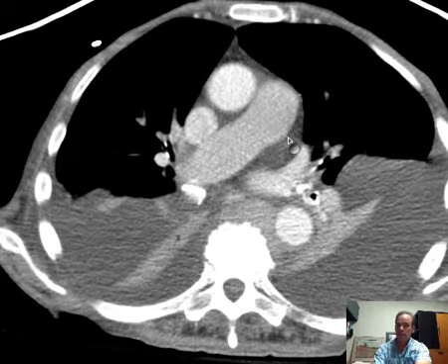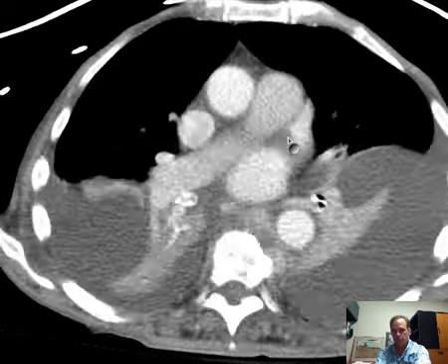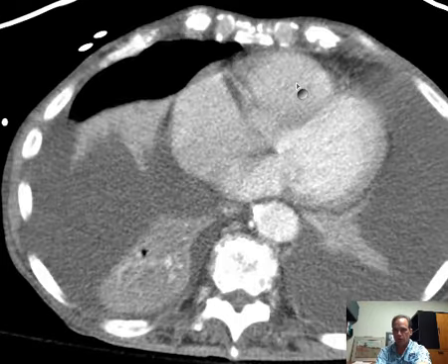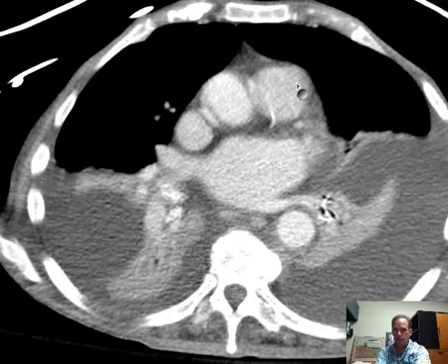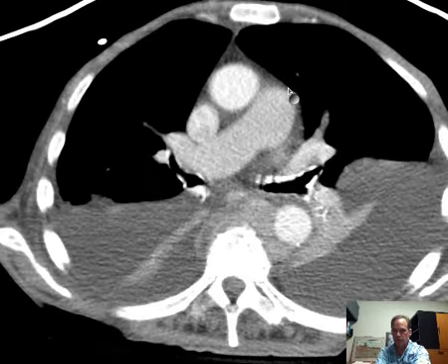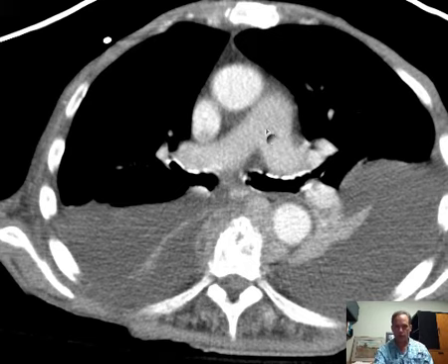And in development, there is a right-sided aorta, which becomes atretic. So again, follow this down. Right ventricle. Follow it up. Main pulmonary artery. Follow the main pulmonary artery. What does it do? It branches. It divides in a Y shape. You see that Y? It divides in a Y shape, and it does it right under the aortic arch.